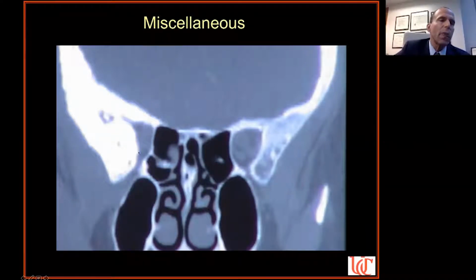Look at this, look at the volume, or I should say, I guess, the area of the posterior eye socket. How this is a nice normal looking volume or area. You can imagine that the volume of the eye socket is much smaller. So this person has exophthalmos and some motility deficits, possibly develop a compressive optic neuropathy. So fibrous dysplasia.